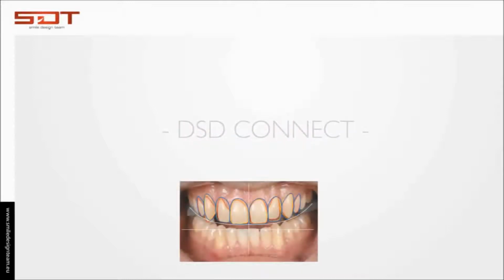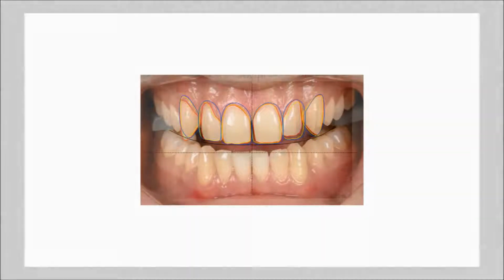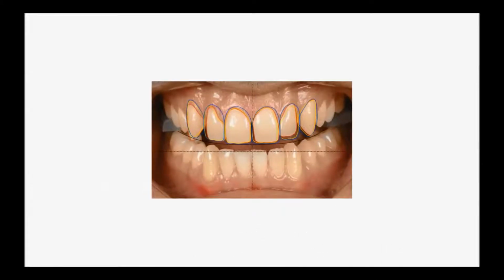At vestibular, once the contours, axis, the incisal curve and the picture are grouped, it is readjusted. The proportions are maintained close to a third of the page size, and it will be placed in the center of the page. Afterwards, they are split from the group and placed each on a slide with a white background, in the same position each image.